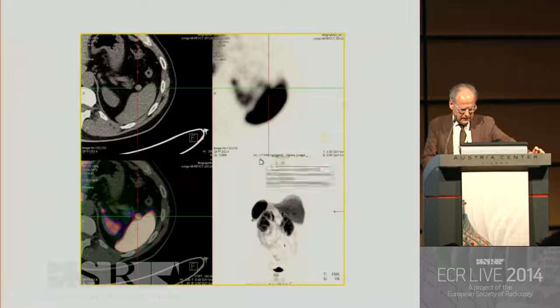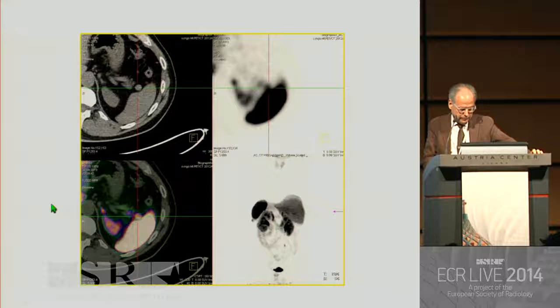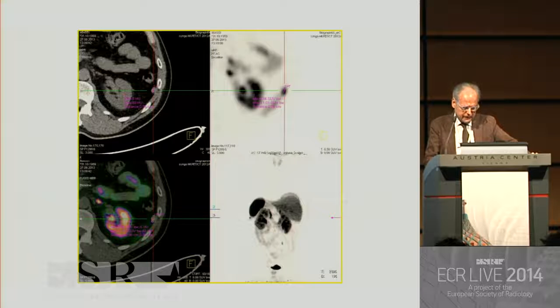So these small masses were detectable, of course, also at PET-CT, with similar imaging characteristics of high signal during the PET-CT scan. We move on. And also this very small one had SUV values of about 9, like the principal lesion at the tail of the pancreas.